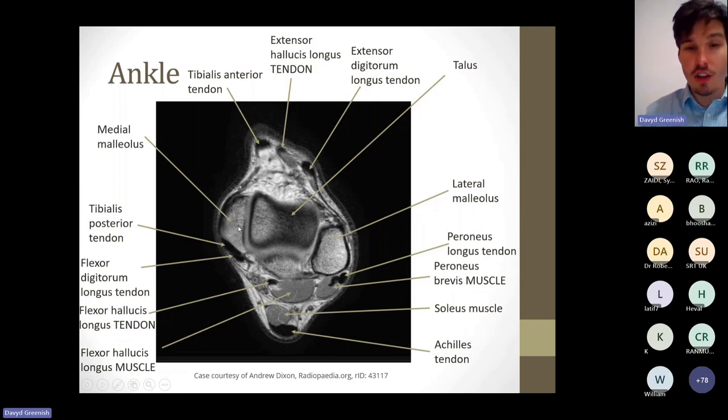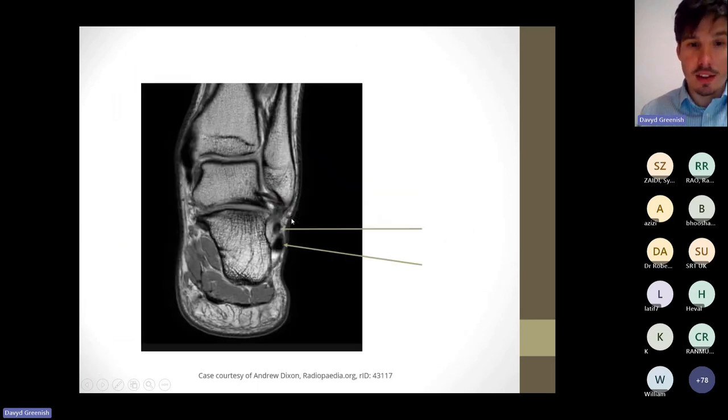So there's a huge amount of anatomy on there. I think you guys do seem to be nailing that, to be fair. Just to show you in a slightly different view, I want to show you these two tendons again. So we're over the lateral aspect. You can tell it's lateral because you've got the fibula, this aspect of the fibula, which is this most superior one.